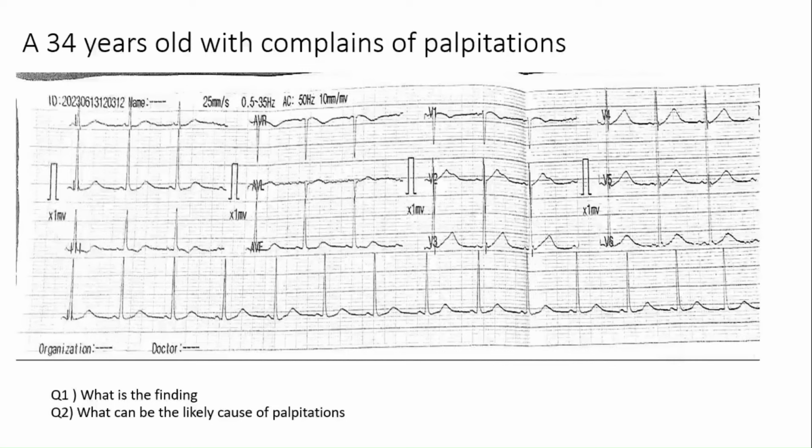Don't miss this diagnosis, please. This is an exam favorite. They will not give you a very long QT. Obviously, at your level, they will give you a bit of intermediate prolonged QT. Don't expect a very long QT, although this is prolonged, if you can pick it. But this is nothing else. This is why this patient is having palpitations.